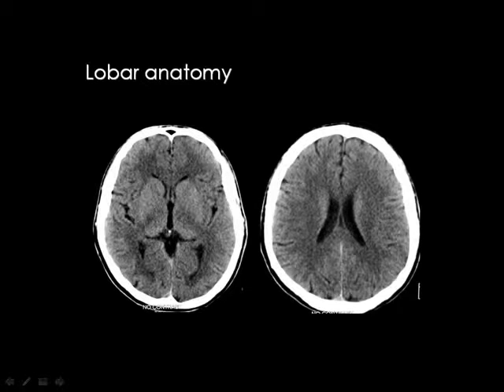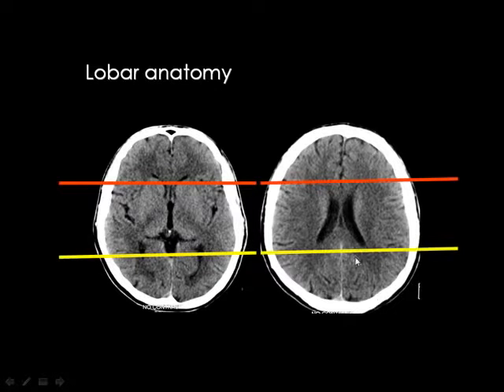Then if you are cutting in the lateral ventricle and you want to know the lobar anatomy, then you draw two lines, one anterior and one posterior, and also in this section, one anterior and one posterior. And you know that the lobe anterior to the first line will represent the frontal lobe, and the lobe posterior to the second line will represent the occipital lobe. Then, what about the area in the middle? The area in the middle will represent the temporal lobe if you are cutting below, and the parietal lobe if you are cutting above. Then how can you know you are cutting below or above?